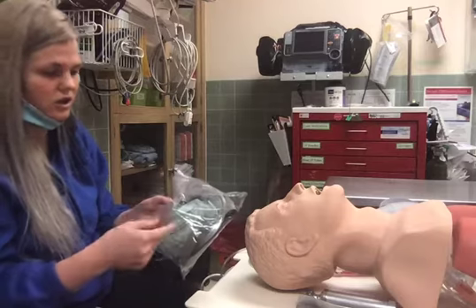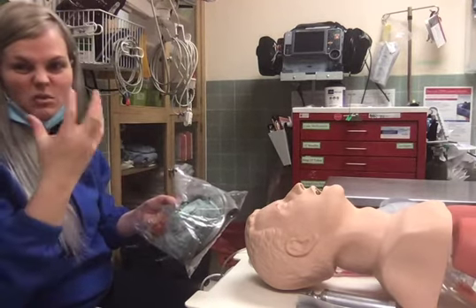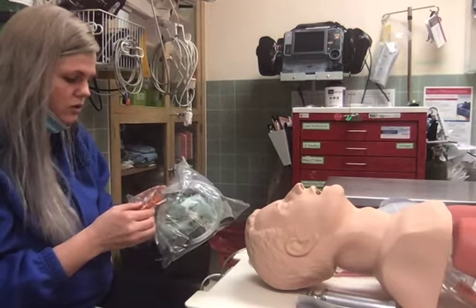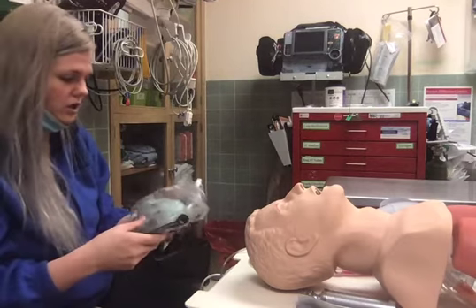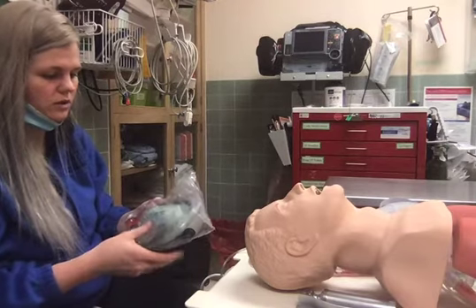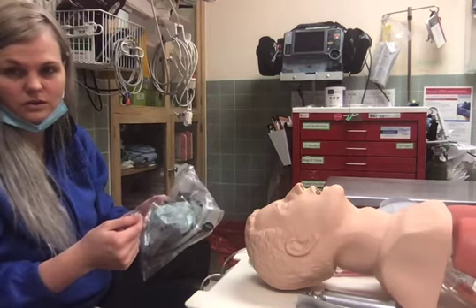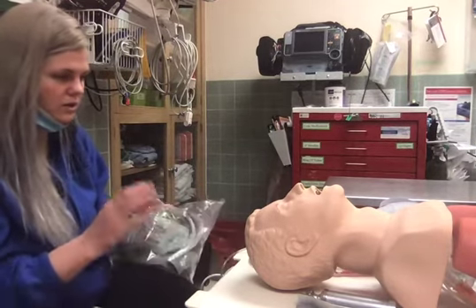You just plug these straight into your wall oxygen, and your liters per minute determines how much pressure you're going to give. You can give up to 25 units of pressure on that patient. That's very helpful in the EMS world and in our ER, where we don't have a lot of resources in a rural hospital, but nonetheless we can give them some of that support.